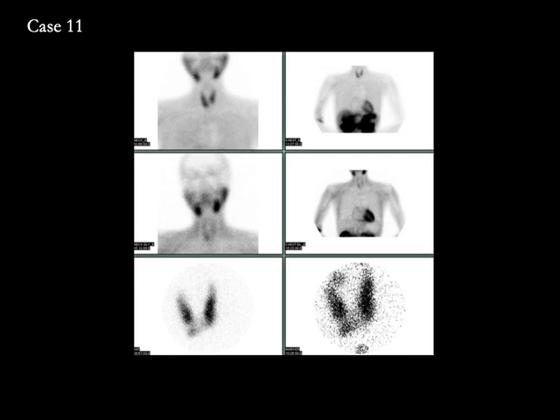Another interesting case, early image showing asymmetric increased uptake at the inferior pole of the left lobe of thyroid, which sort of persists on the delayed images, raising the suspicion of a parathyroid adenoma. But when we followed up this patient with an I-123 scan, the uptake of I-123 is concordant with the parathyroid scan, and the focus where we thought there would be a parathyroid adenoma, which is not expected to take up I-123, there is some iodine uptake, suggesting that this focus here, seen on the parathyroid scan on the early image, delayed image, is actually a thyroid adenoma because it takes up I-123. Here is another image with the markers.